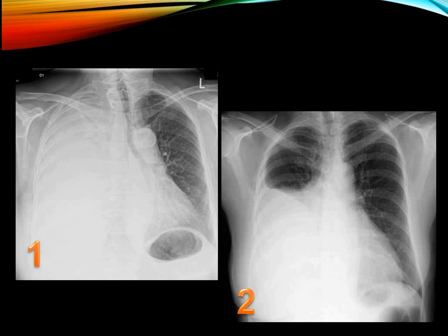If the pleural effusion is of a smaller amount, we will see it like chest X-ray number 2. If you notice, part of the lung is still spared and the inferior border of the lung is making a meniscus sign. So if we comment on it, I would say there is a homogeneous opacity obliterating the right middle and lower lung zone and causing meniscus sign with the remaining tissue of the lung, and this is mostly due to the pleural effusion.